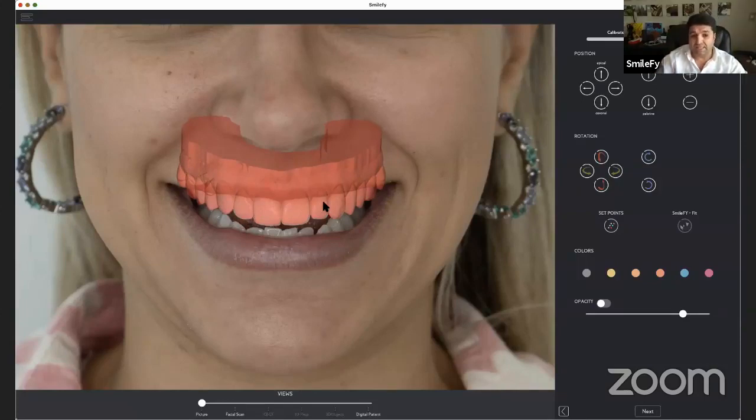But for 3D design, we use the intraoral scan as a reference anyway. So if the molar, for example, is not very precisely calibrated with the picture, it's not such a big problem. Other systems, other companies in the world, distort the picture and trick the perfect calibration, so that you have a picture that is exactly matching the STL.